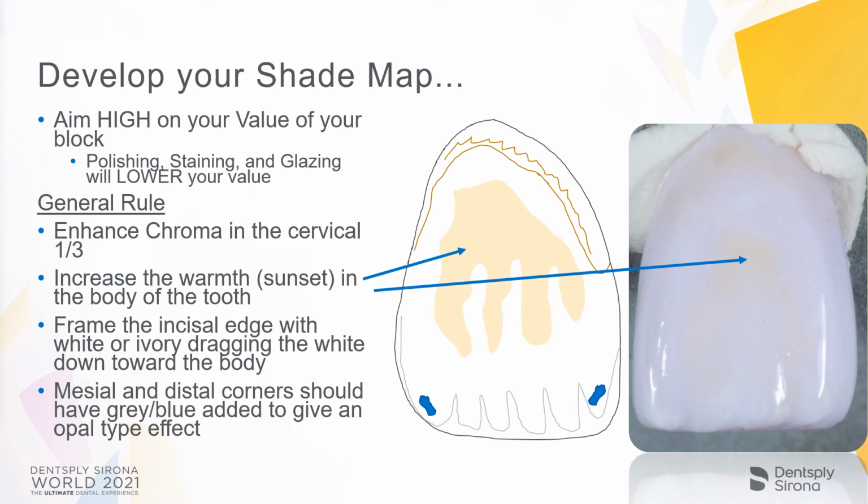I don't do makeup. I have to imagine if I did makeup, I might be pretty decent at it. One thing I learned from my wife is a little makeup goes a long way. Same thing when you're applying your stains and glazes to your lithium disilicate restorations.